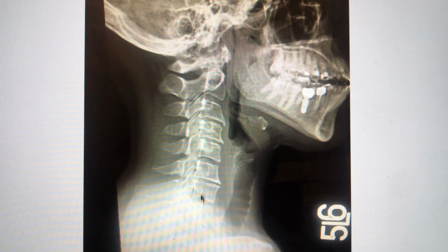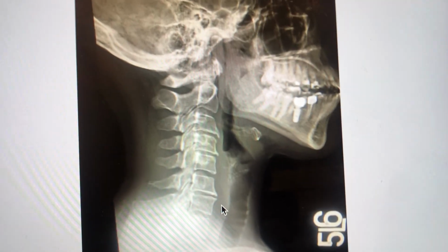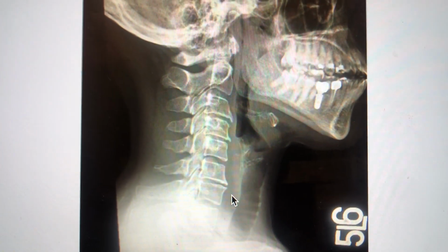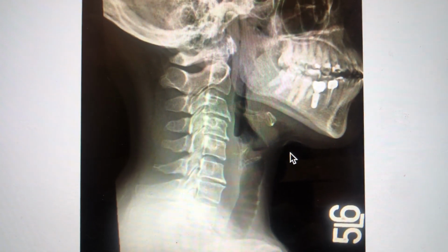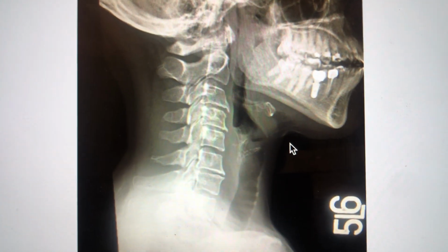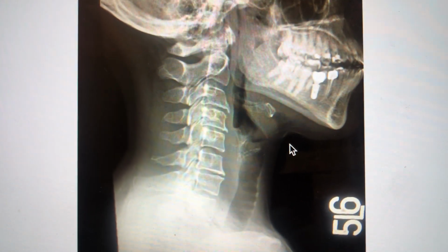This neck is almost straight. Most necks, and optimally we think, necks ought to have a curve. The curve probably serves many functions, including dissipating axial loads more effectively than a straight neck. But we do see straight necks frequently. They do correlate more often with neck pain, but the neck pain is not universal in straight necks. So we don't exactly understand for sure the relationship between straight necks and neck pain or degenerative changes. We just know that there's some correlation there between those things.